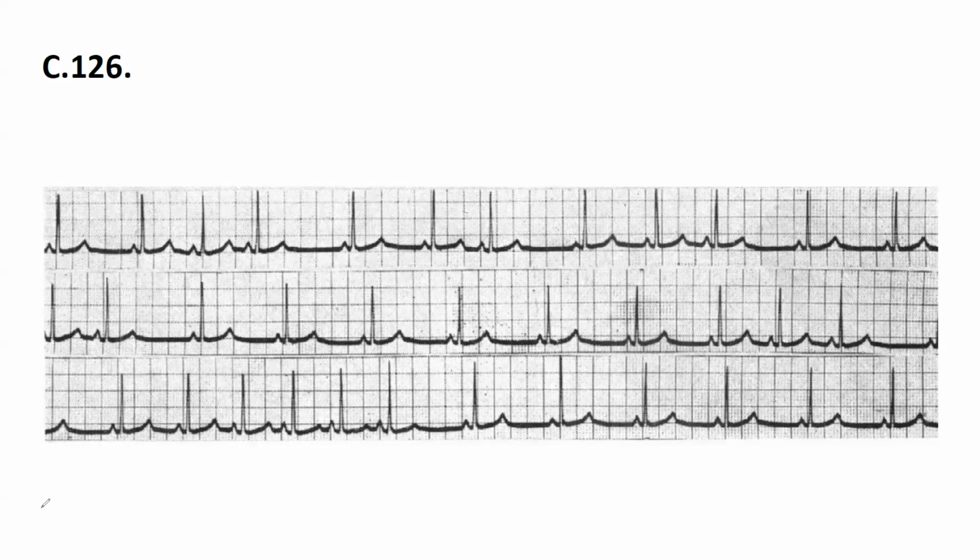So this is a regular but very slow rhythm, I think. Is it regular? I mean rhythmic. This is a consequently recorded tracing, lead number 2, all of them, and this means it is arrhythmic for sure. Sometimes it's rhythmic, but sometimes it's not. Okay, all right, now let's consider this.